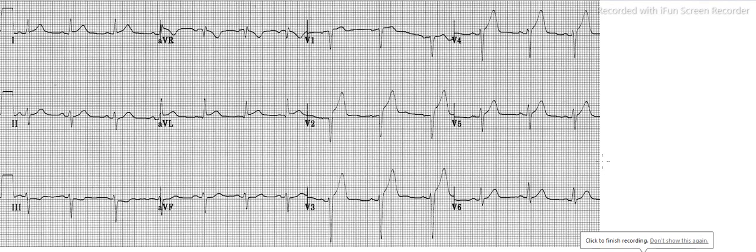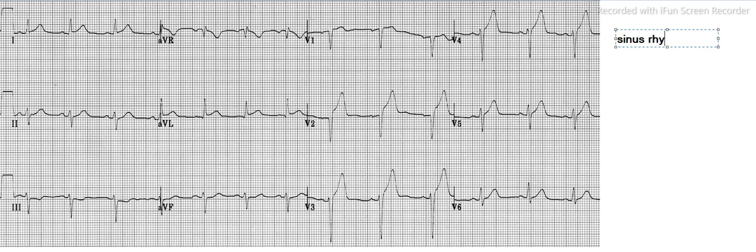To all. In this video, we will be discussing ECG and go systematically, and we look for if there is any morphology or not. Since there is no single rhythm strip, first of all we need to find out whether the given ECG falls under sinus rhythm or not.